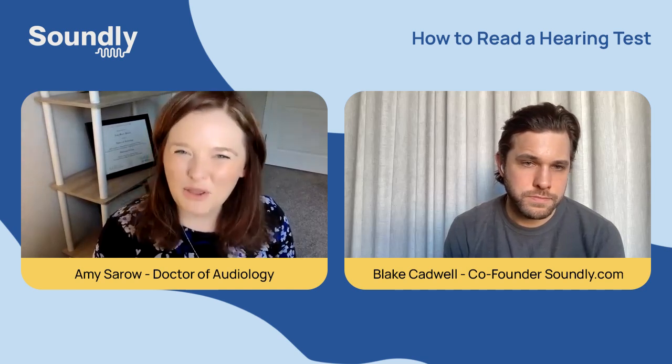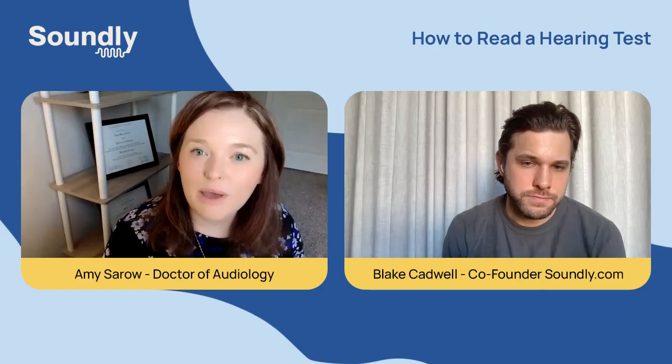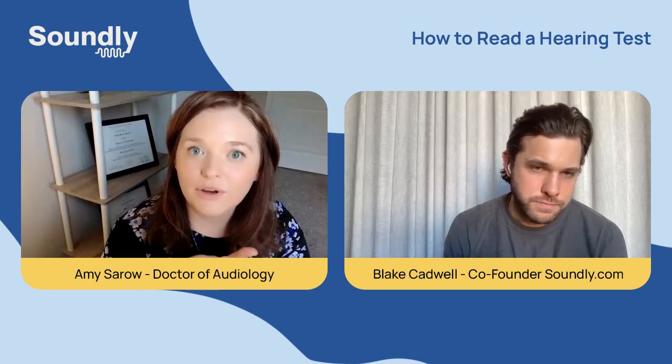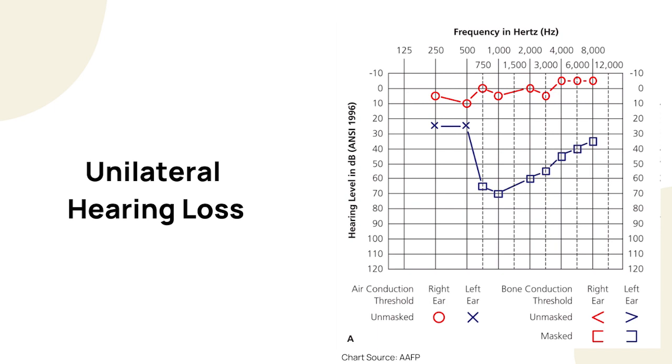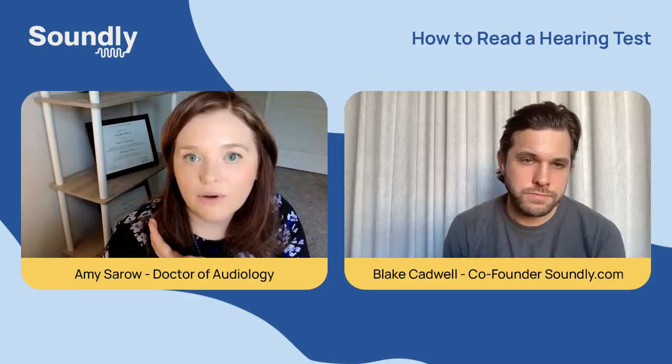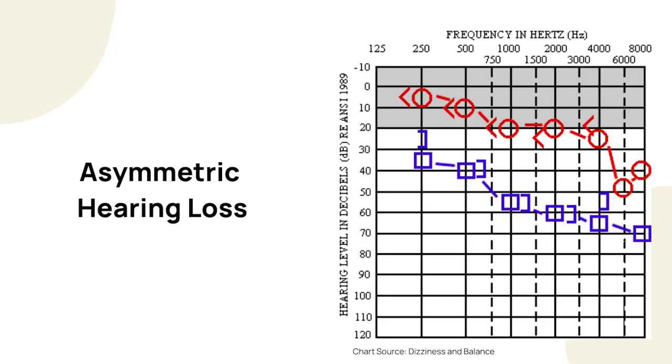Then we already talked about the cookie bite hearing loss, where you have that piece in the middle that goes down. So we have more hearing loss in the mid frequencies, but better hearing in the low and high frequencies. And then we have a unilateral hearing loss, which means hearing is normal on one side, but we have some degree of hearing loss on the other side. And then we have an asymmetric pattern, which means both ears have some hearing loss, but one ear has more hearing loss than the other.